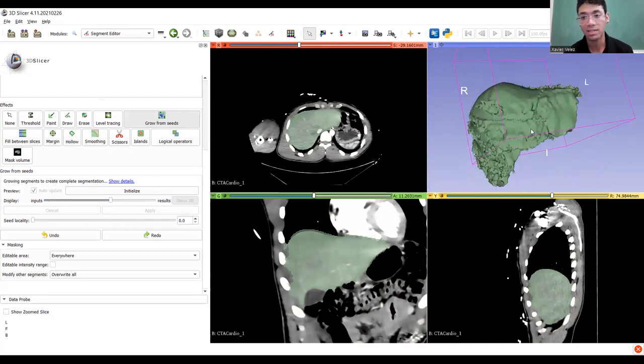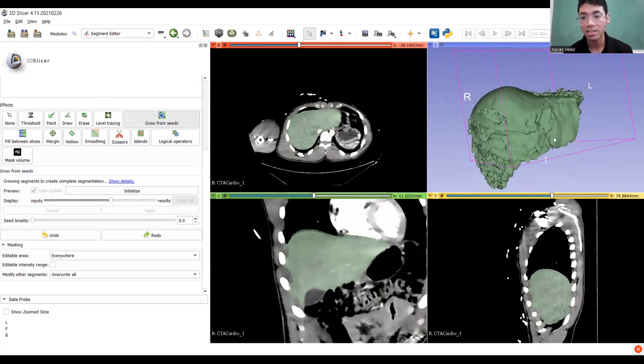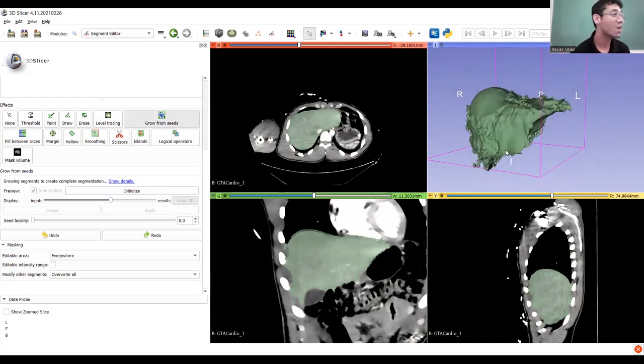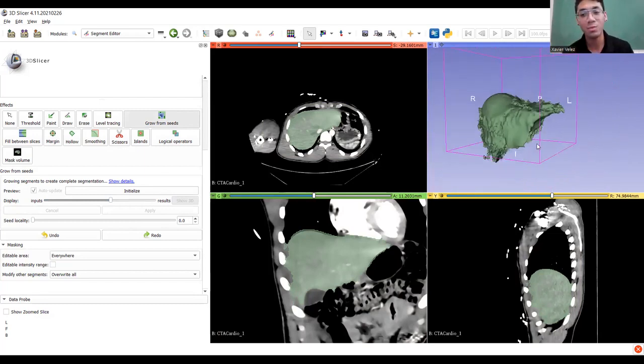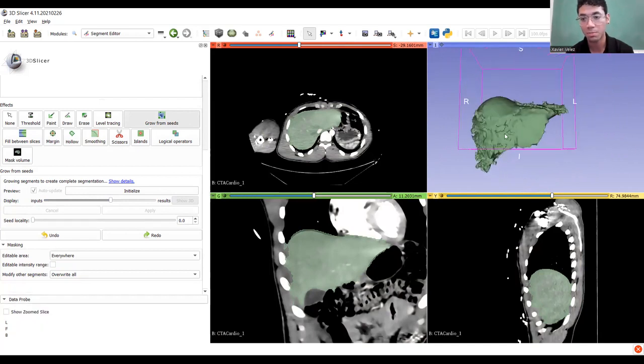Okay. That's disgusting, right? Super messy, super gross, but generally, because we know it's a liver, we can probably be like, yeah, that's a liver. But I think if anyone else were to see this, they would have no idea what it is. So now comes my favorite step, where everything starts to become a lot clearer in terms of what it is. And that's going to be the smoothing step.